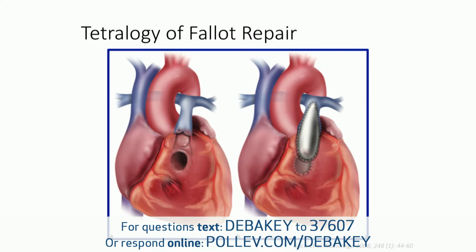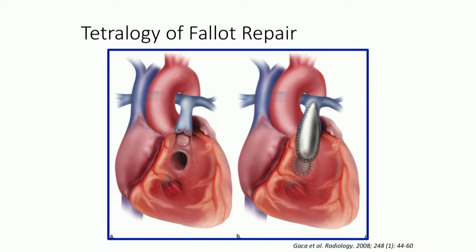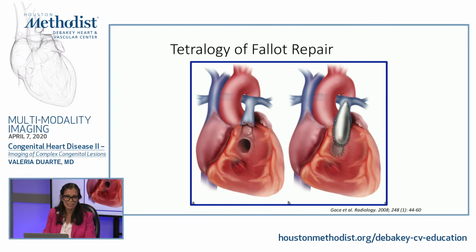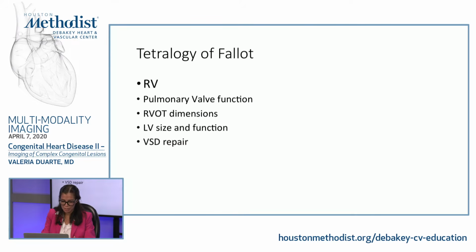Okay, this is different. In patients who have a transannular patch repair, the pulmonary valve annulus is not intact, so most of them have significant pulmonary regurgitation down the road. On the other hand, patients that only get an RVOT surgery, a valve sparing repair, for those the pulmonary valve may be in very good shape long term. So that's why knowing what kind of surgery this patient underwent is very important for us, okay?